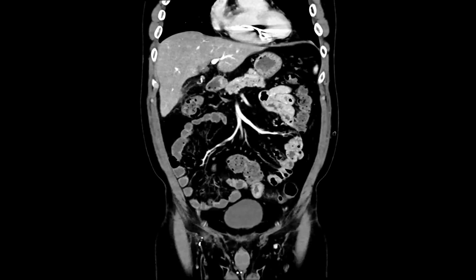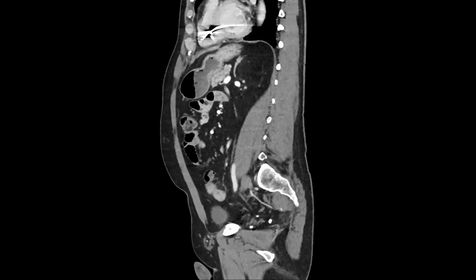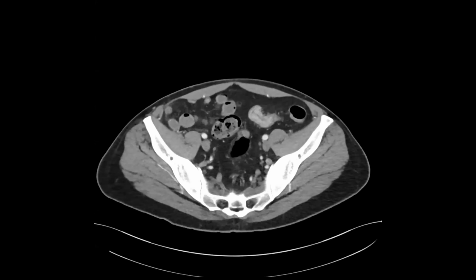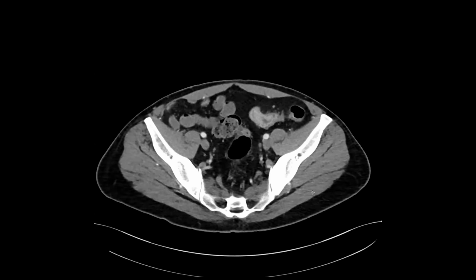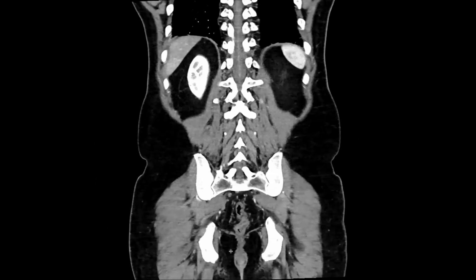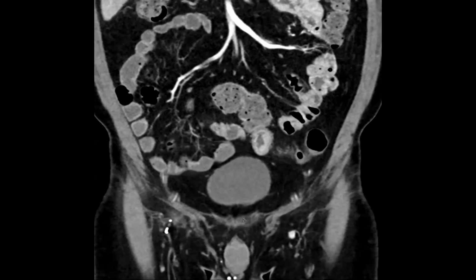Is there bowel that's abnormally enhancing in the left lower quadrant? Yeah, what do you think about that? Is that sigmoid colon? Axials? It's like a long segment of wall thickening, but it looks kind of apple core-ish. I feel like you have to bring up malignancy again. Yeah. There's a little mesenteric congestion too, but if it's an older patient, definitely scope to rule out a malignancy. Yeah, this was another case of incidental colon cancer.